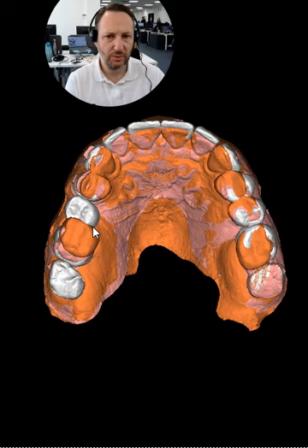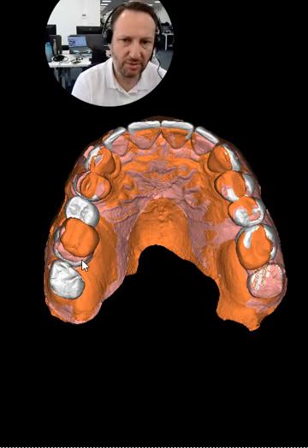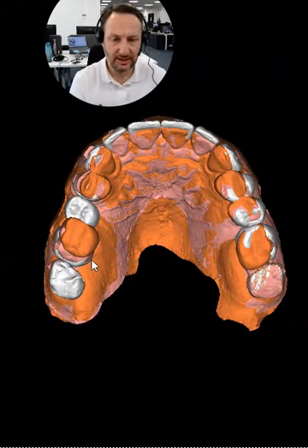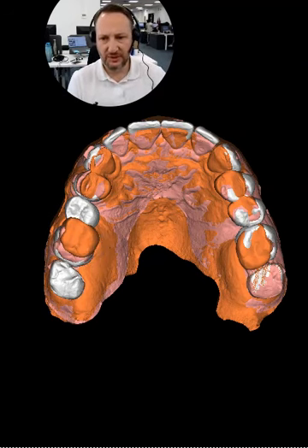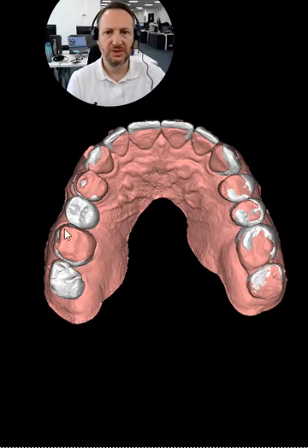This way we could improve the space for the implant and allow the implant to be positioned in a better place. So understanding first where the ideal final position is, is always the most important thing we need to do before planning the implants, before starting any treatment. In this case, we could finish with a great outcome after one set of aligners, and the case is ready now, so we can move to the next phase to do the restorations, and we can now place the implant properly in the ideal position.